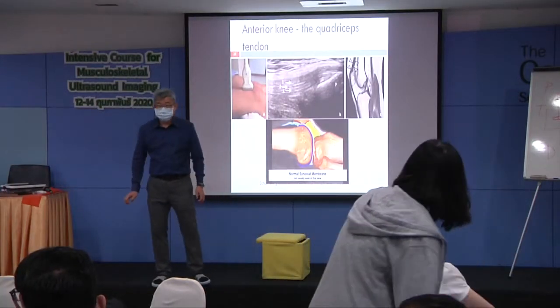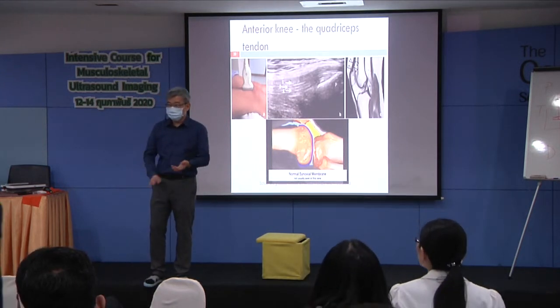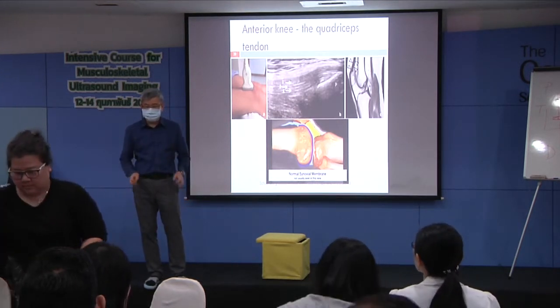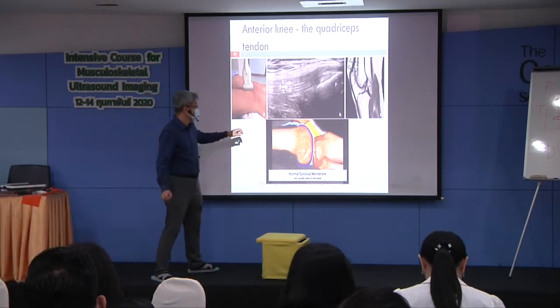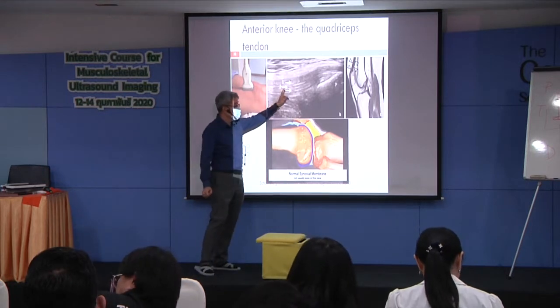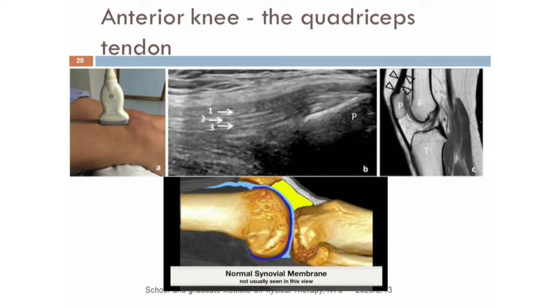Okay, before lunch, we need to review some structures we learned today about the knee, and I'm going to introduce some other structures for the afternoon. So, quadriceps tendon, patella, Hoffa's fat pad, femoral, pre-femoral fat. These all need to be clear in your imaging.